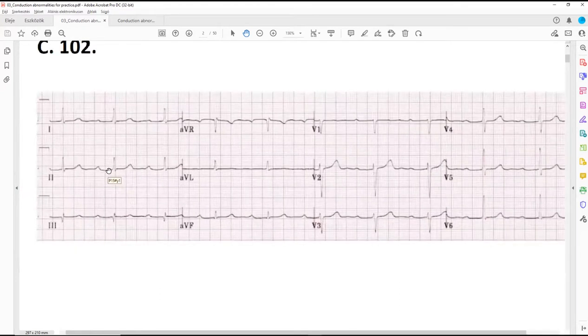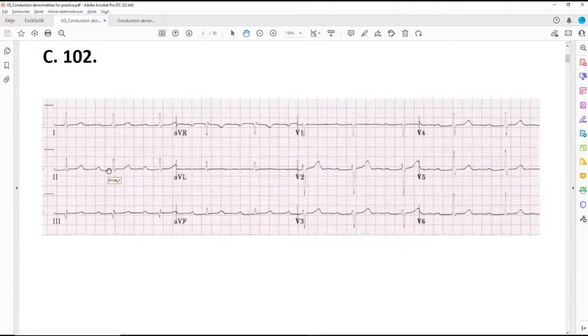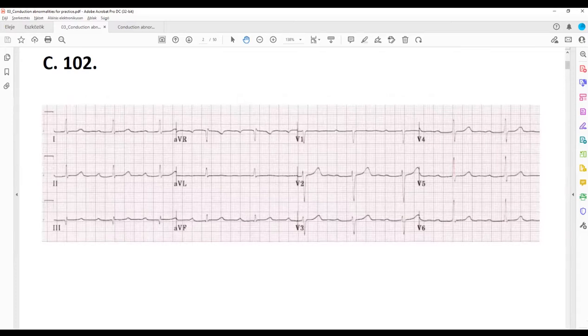We have an atrioventricular block, and it's a first degree AV block, first degree because it's rhythmic and every time the impulse goes through. Next, the width of the QRS is narrow, so there are no intraventricular conduction abnormalities, no excessive deviation, so you can conclude it's a first degree AV block. Was it clear, everybody?